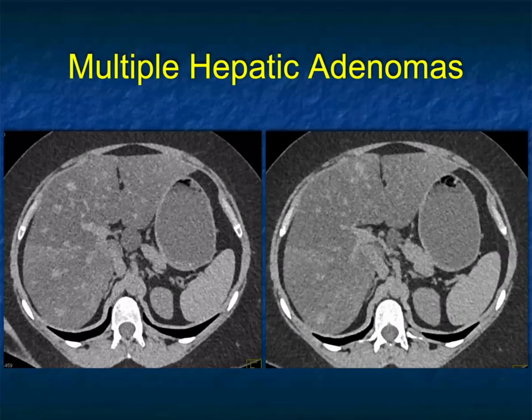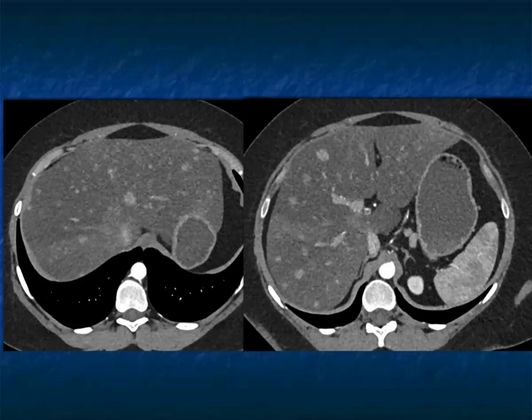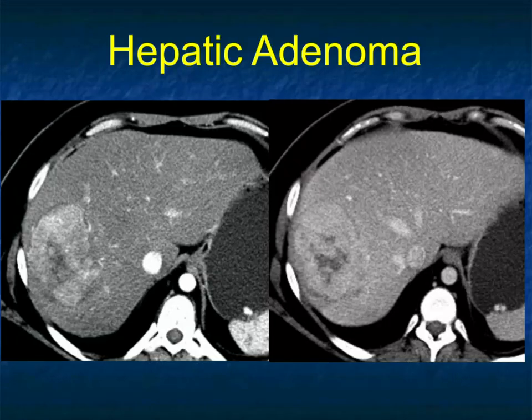So I think one of the things I'm trying to show you is hepatic adenomas are much more challenging, where the majority of FNHs have a classic appearance. Hepatic adenomas can be atypical in this multiple appearance, can be infiltrative rather than mass-like or simulating infiltration while there's still a solid mass, and can look very much like a case of hepatoma.